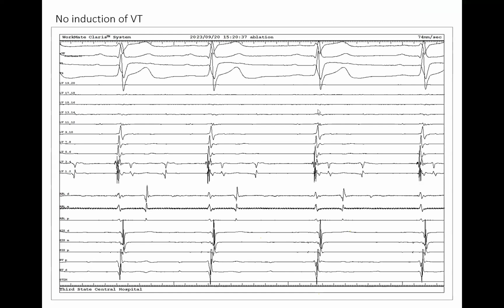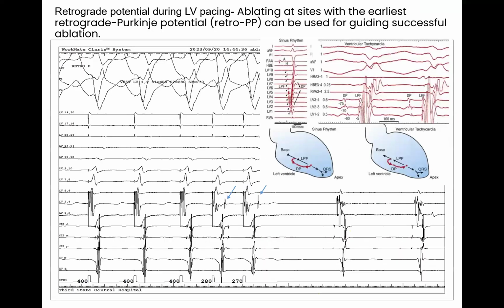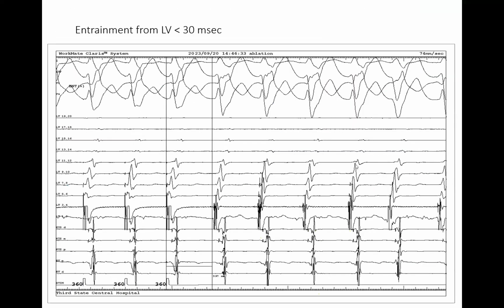Yeah, this patient showed HV interval reproducibility with one-to-one correlation during VT. So I think it favors fascicular VT. However, the QRS duration and configuration of the ECG also favor papillary muscle VT, but I can't understand why this EGM always shows HV one-to-one conduction.